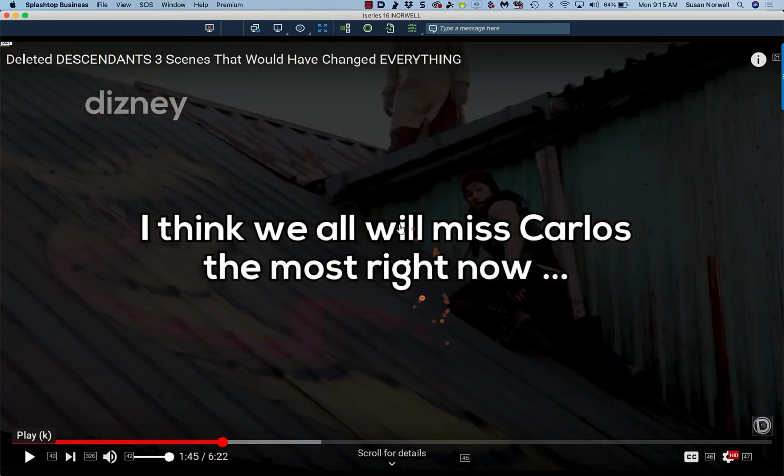Okay, so a couple of things about this particular video that I just chose at random: it has some print. So is the kiddo showing any? You could see me reading the print because my eyes were going all across it. As speakers changed, I looked from one side to the other. If you are curious as to whether you have a kiddo that can reach the upper right-hand corner or the lower right-hand corner or the left corner or the upper left corner, or the bottom middle, then what you're going to have to do is curate your videos a little.